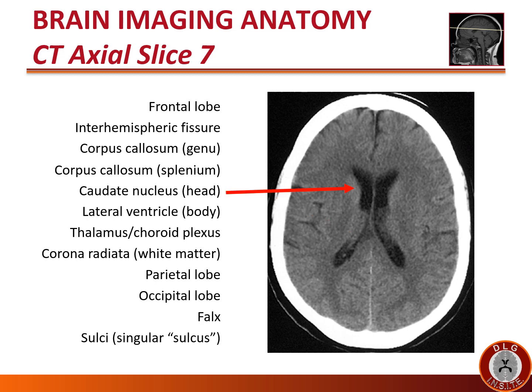The word caudate in Latin means tail, and the caudate nucleus is a tail-shaped structure that follows the lines of the lateral ventricle. Here we still see the head of the caudate nucleus cut in cross-section. The caudate nucleus is part of the basal ganglia and is composed of densely packed neurons. It's a gray matter structure. Thus, the color is a lighter gray, just like the cerebral cortex.